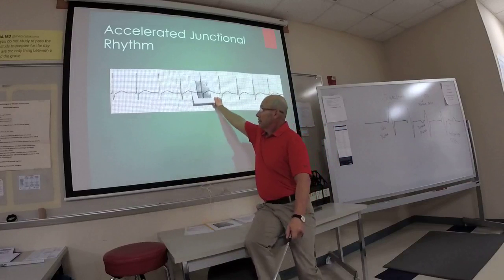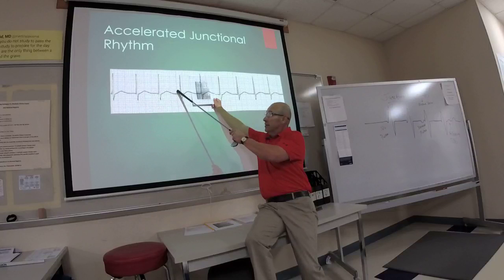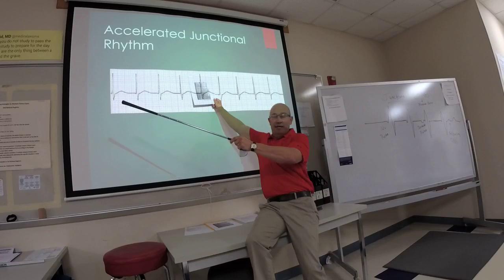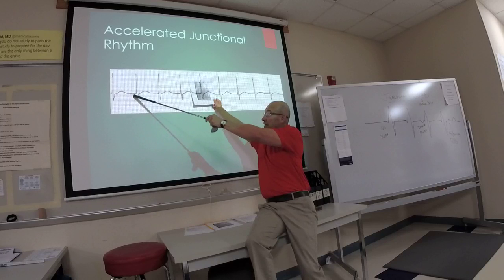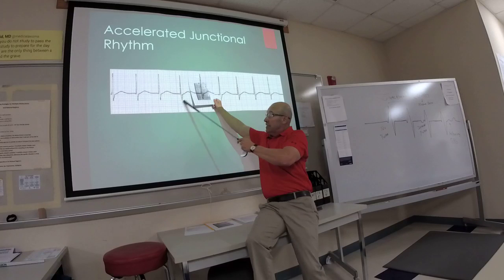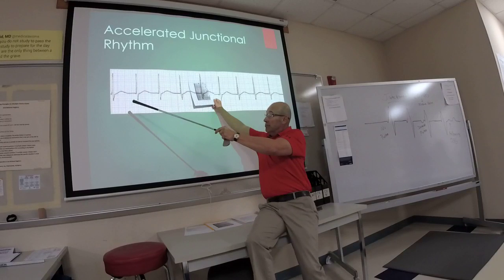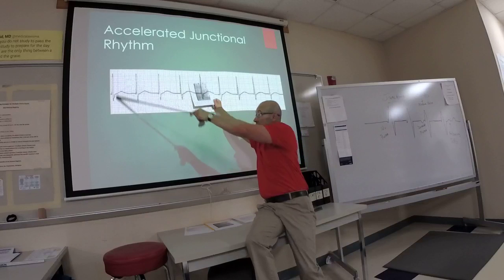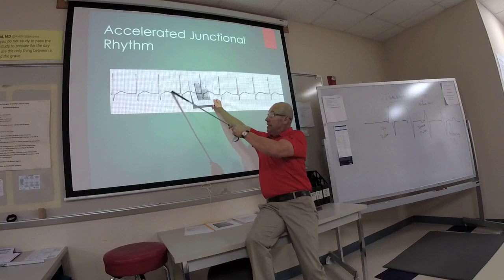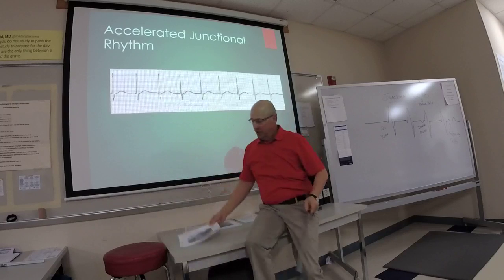If you can, picture this part right here. Of course, they'd be all spread out, right? The QRS complexes would be spread out. But no P wave, no P wave, no P wave. If that was 6 seconds of EKG right here, then that would be a rate of 40-ish, because this is not all there, but a rate of 40-ish, okay? And there's no P wave.